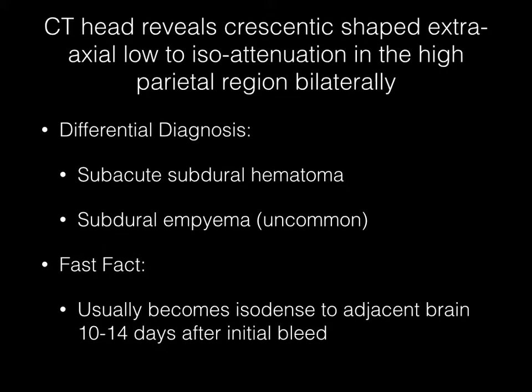This single axial CT image of the head reveals crescentic shaped extraaxial low to iso-attenuation in the high parietal region bilaterally. Your differential diagnosis should include subacute subdural hematoma and, less likely, subdural empyema.